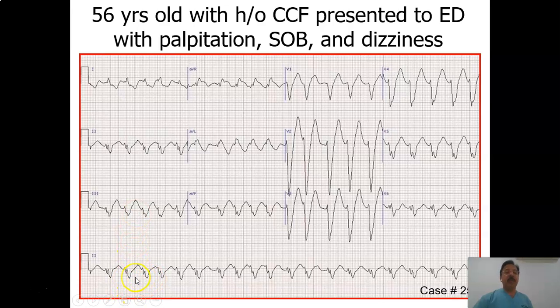The rhythm is irregular, so probably this is atrial fibrillation, but QRS complexes are wide.